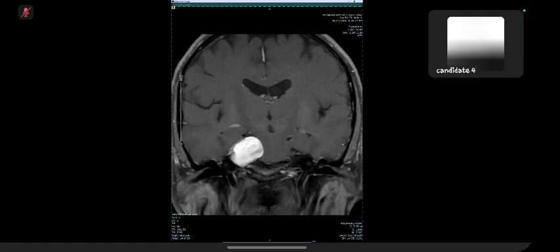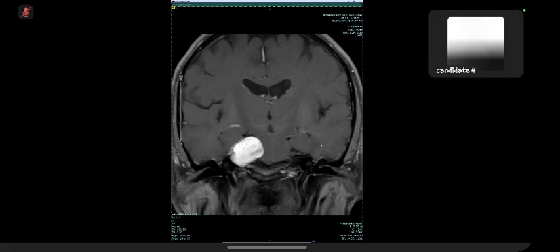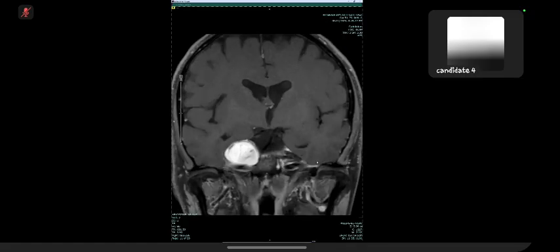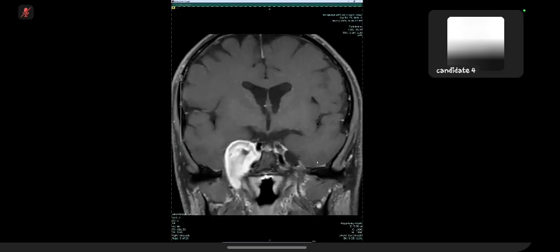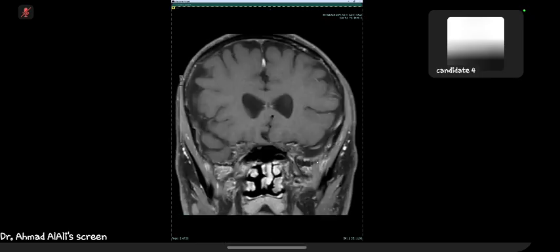Yes, I will convey my findings to the referring physician. I would suggest a neurosurgical opinion for further management, and I would also take a look at the rest of the cranial nerves on this post-contrast image to see if there is any multiplicity of the lesion, to rule out the possibility of any phakomatosis or neurocutaneous syndrome.